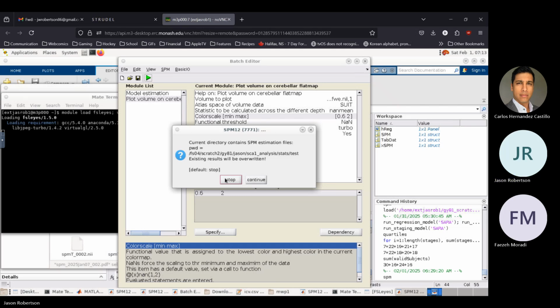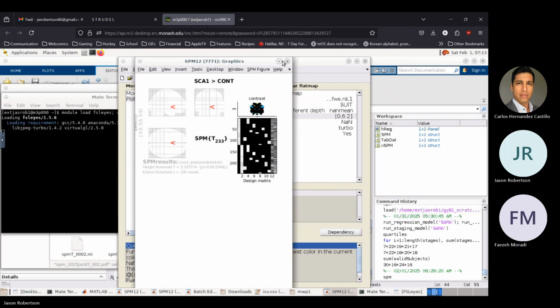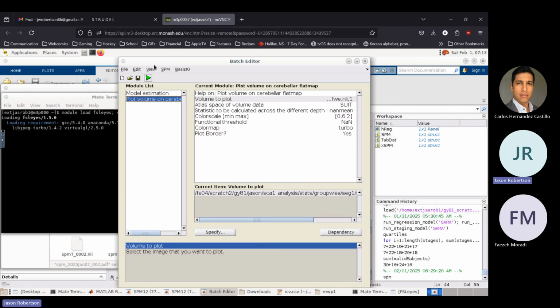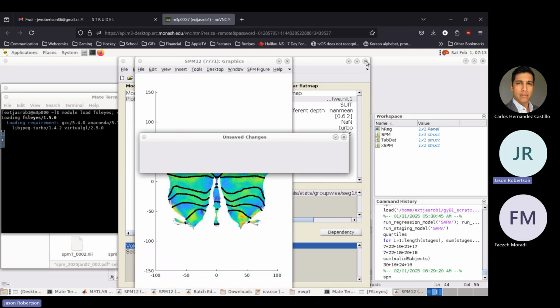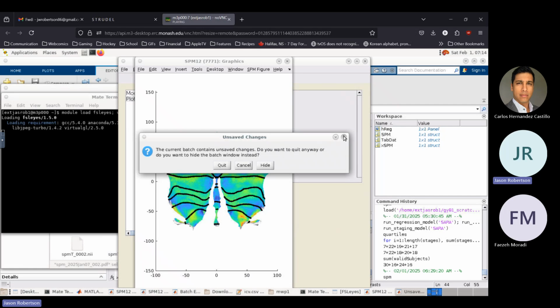Oh, oh, the hell on. No, I only want this one. I'm going to close. Oh, nope. Never mind. We got it. Cool. Okay.